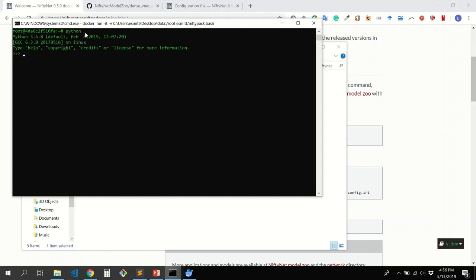If I am in Python, I can use TensorFlow without problem, as tf, and maybe it works very well, and create all my variables here using TensorFlow.